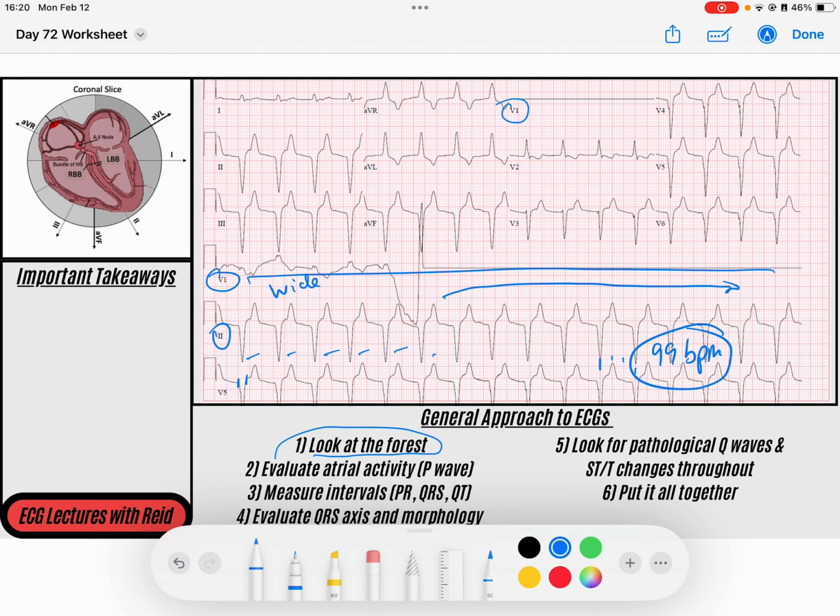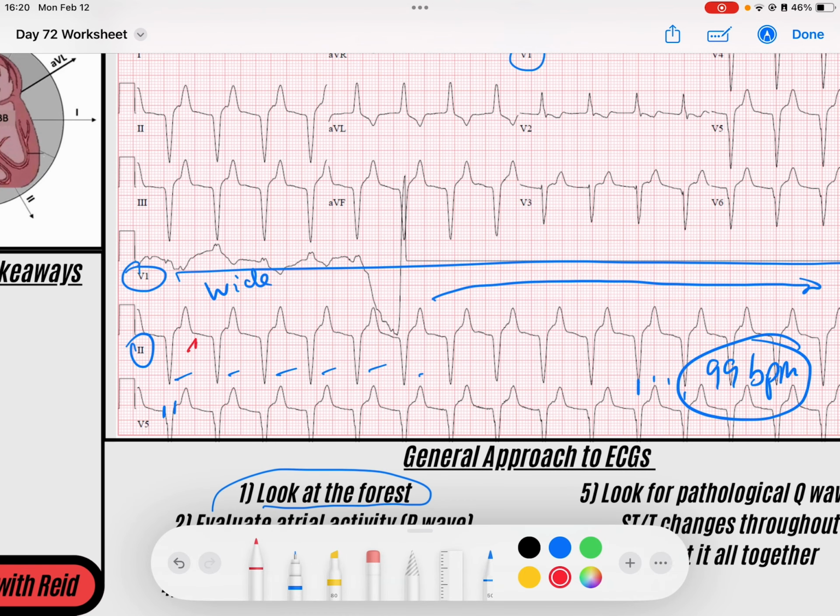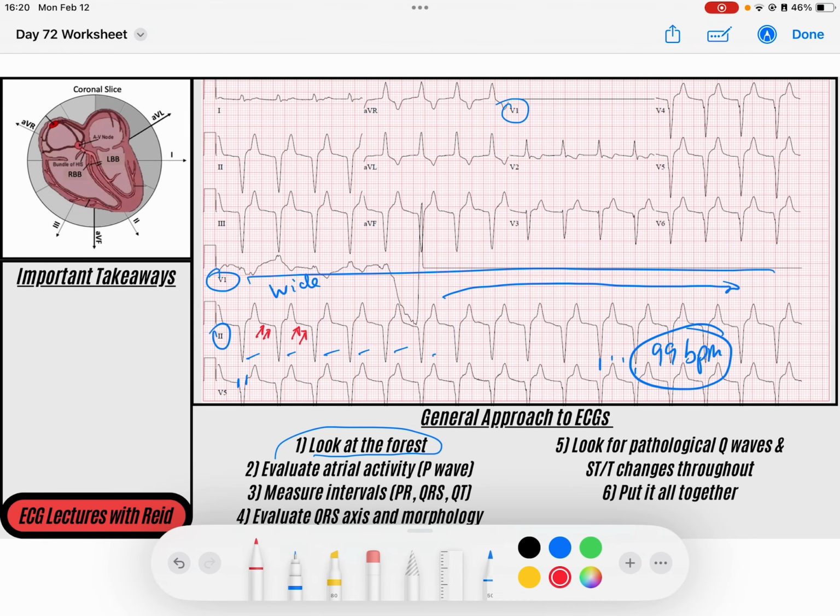And I like to just take a glance and see, well, is this a sinus rhythm? What's going on? And yeah, I don't see P waves. So if you haven't watched yesterday's video, this will be fun, right? To contrast, a rhythm that's regular, but doesn't have P waves. What's going on? So let's look a little deeper, evaluate for our atrial activity. Let's just look for P waves before our QRS. We'll scan through a little bit more. We'll maybe look up here in lead 1.